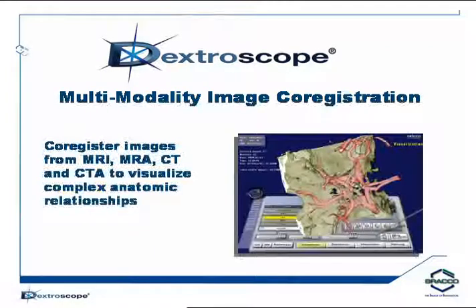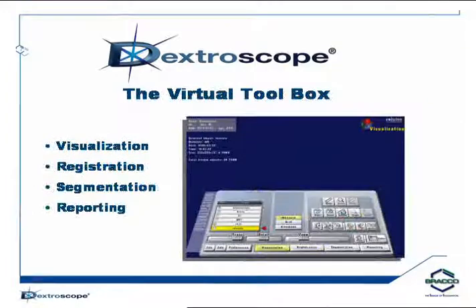Next. You also have the ability to do multi-modality image co-registration. So as I said before, you can take a CT or an MRA or an MRI and register all those volumes together. Next.